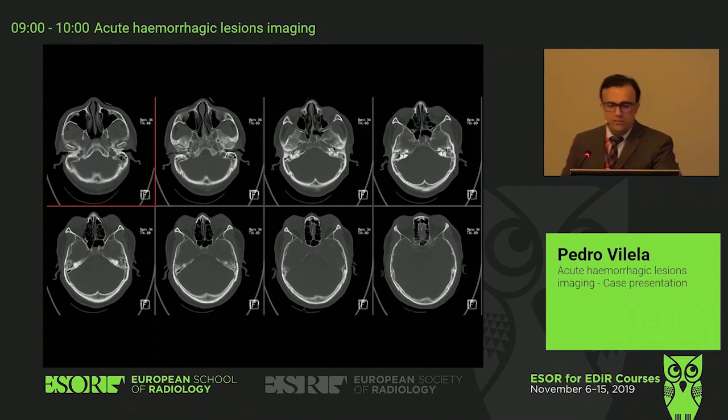And now, what can we tell about the bone windowing of this patient? Do we see anything that is worrisome for the patient? So let me help you. There are a couple of things that we should look at.